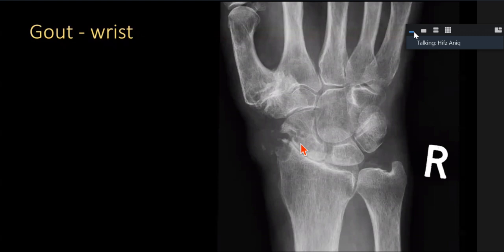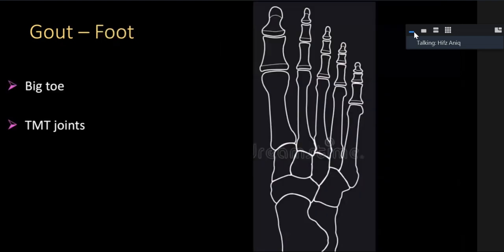We did the uric acid, and the patient also had a raised uric acid. So we thought the patient has CPPD as well as overhanging erosion, suggesting that there's gout, with soft tissue swelling as well. So sometimes the circles I showed you in the beginning can overlap or they can coexist at the same time.